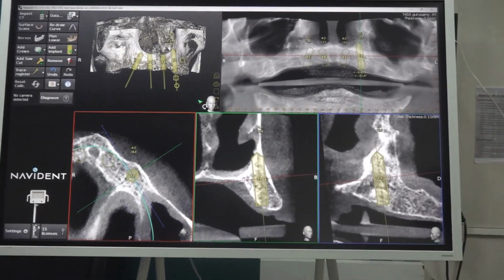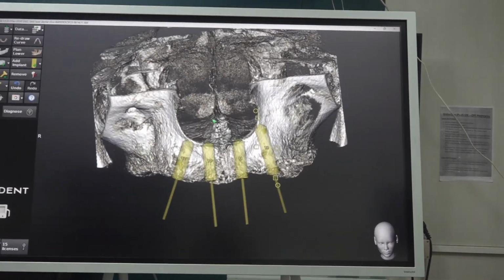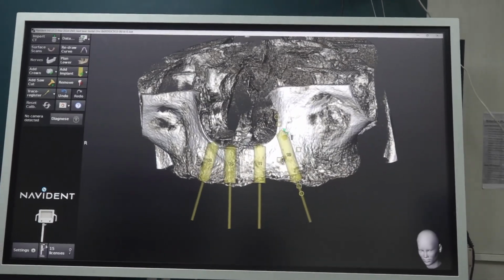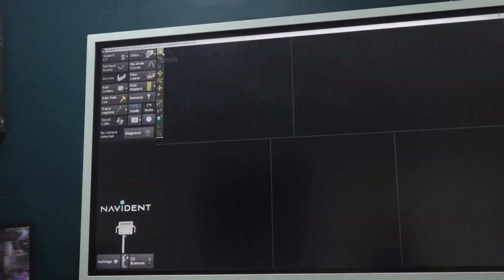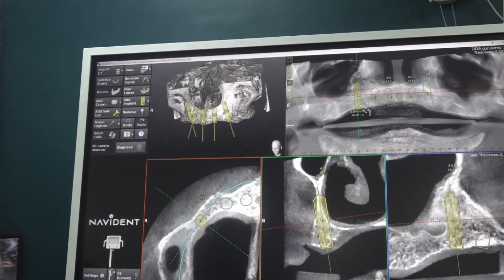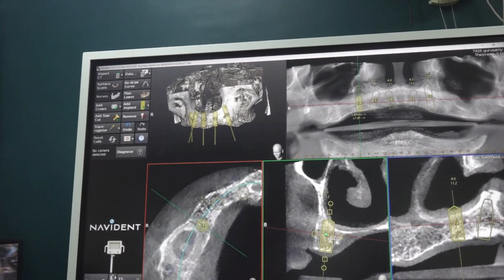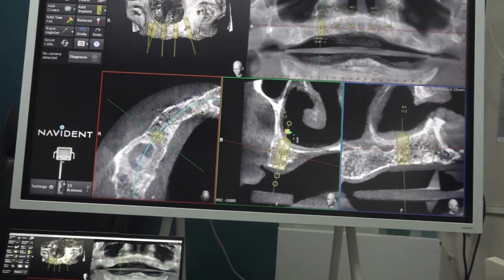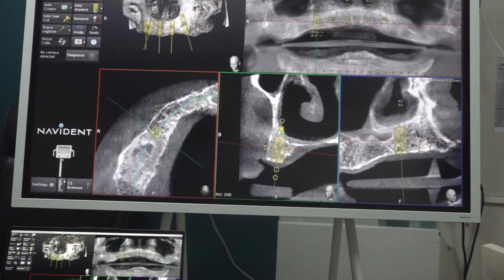So this kind of long four. Two central. Two nasomaxillary buttress. This corner we are targeting. Behind this, an implant can be placed. That's what we are going to check. A short implant we can place. Right? A short implant means around 10 mm we can place. 10 mm or 8 mm.